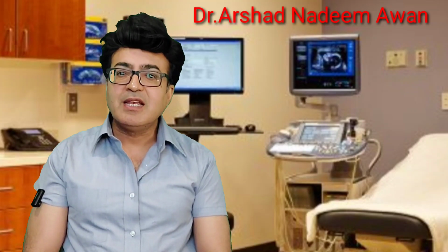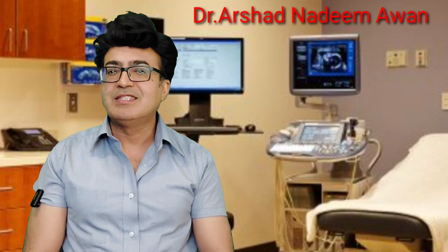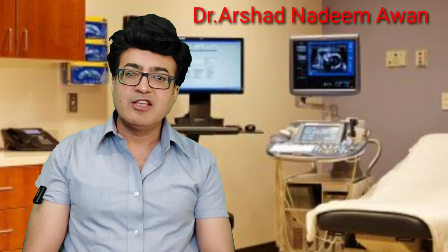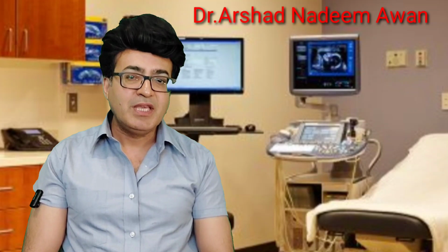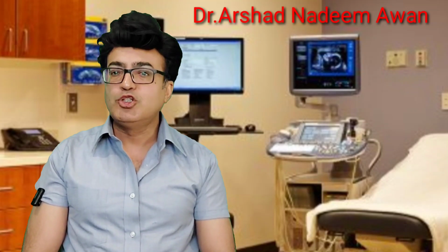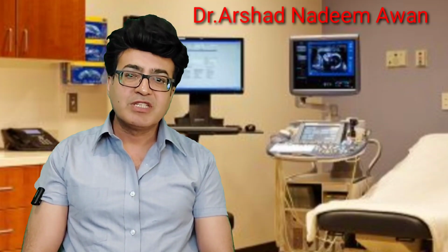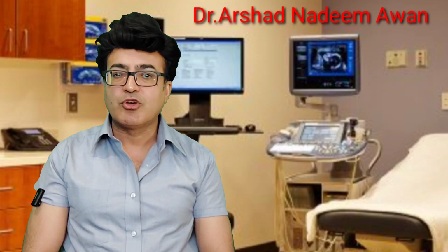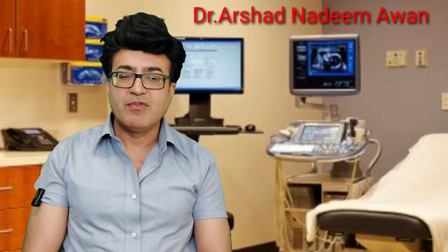So there will be internal incomplete septa. Normally in a loculated cystic lesion, you will see a complete septation from one wall to another wall. But in case of hydrosalpinx or pyosalpinx, you will see that these septa will be incomplete. This is a very important feature. Whenever you come across any tubular lesion or cystic lesion having incomplete septa, you must consider this would be an inflammatory disease, a hydrosalpinx or pyosalpinx, or due to pelvic inflammatory disease.